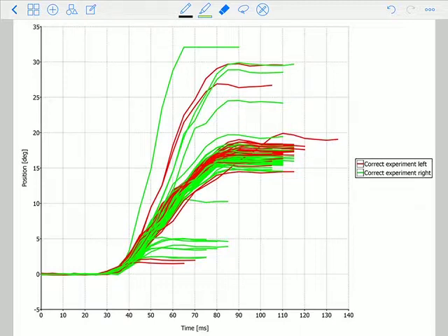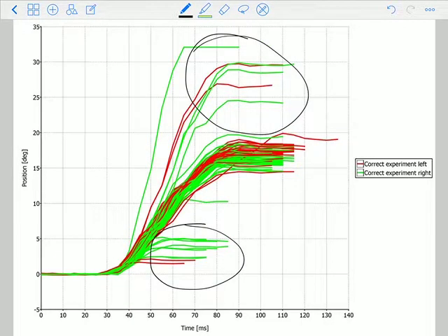What I have in front of you here is her first saccadometer results, the position graph. As you can see, she has quite a bit of scattered greens, more greens than red. I'll show you the raw numbers.